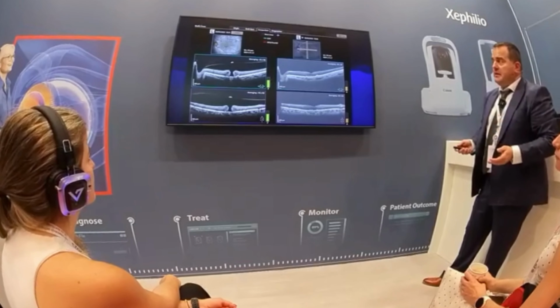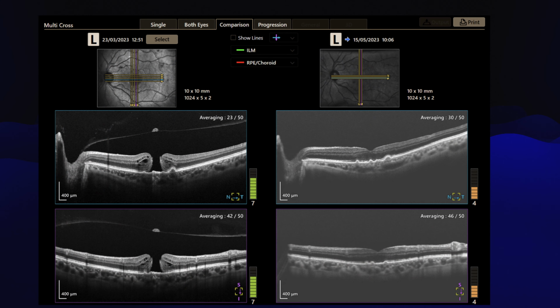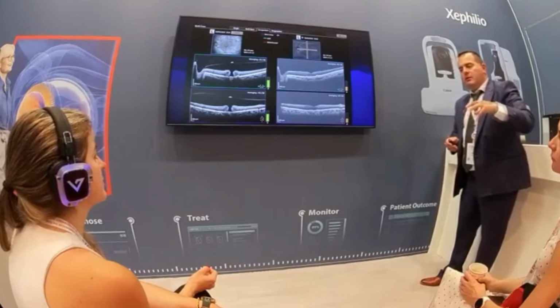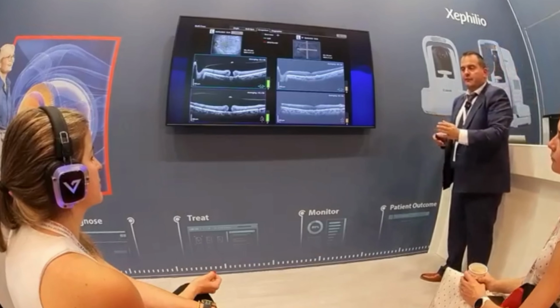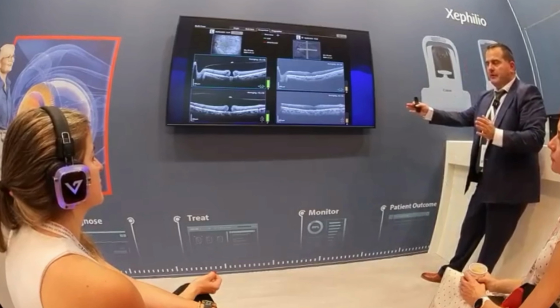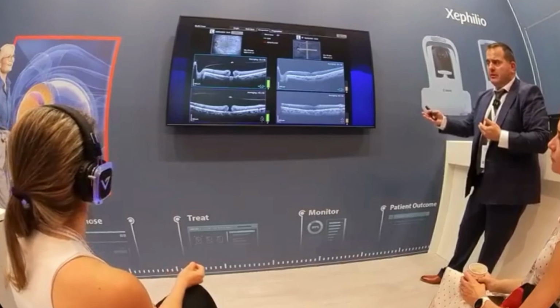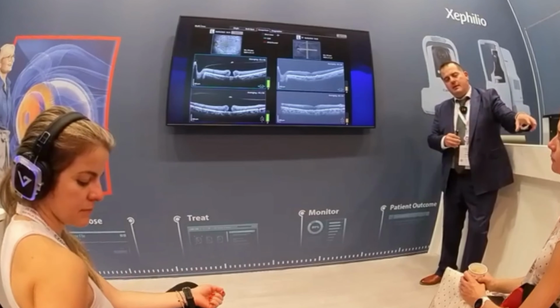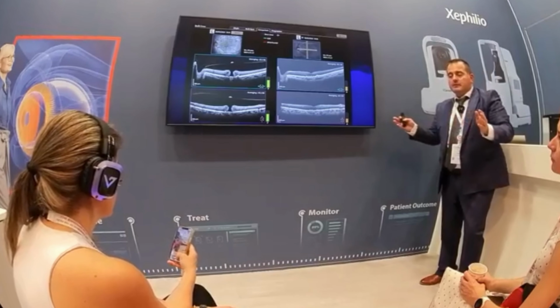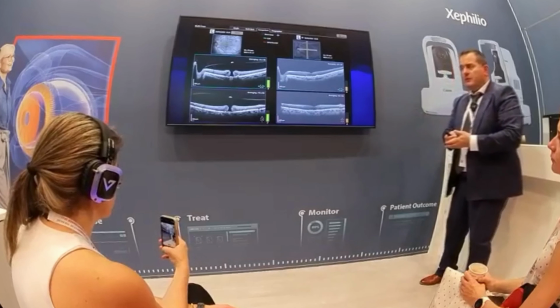surgeon. Another case, again a macular hole, and here this is a partially gas-filled eye. My main point here is that in macular hole surgery, if you are able to show the patient every stage of his treatment journey, it is beneficial for him and also beneficial for us, because we know that nowadays we are trying a bunch of different techniques to close the macular hole, from classic ILM peeling through certain types of ILM flap, ILM envelopes, even retinal autografts.